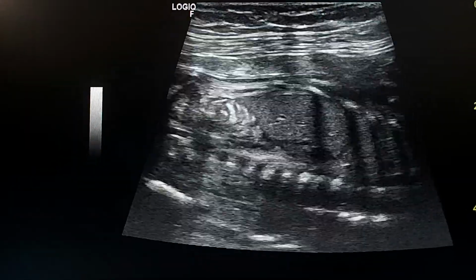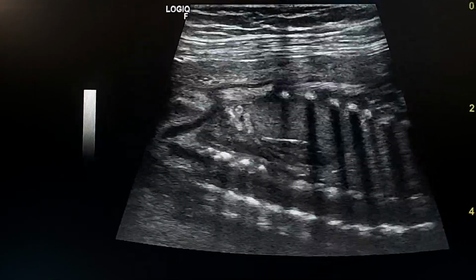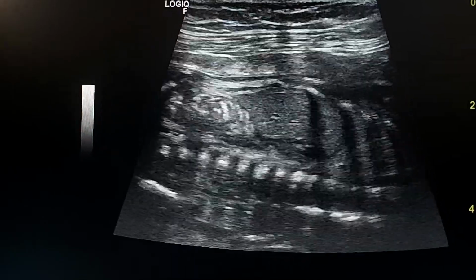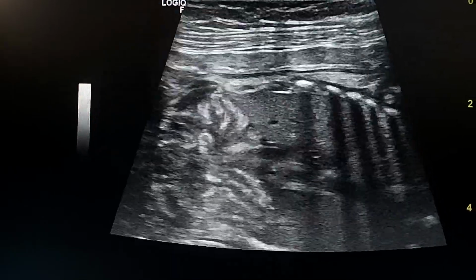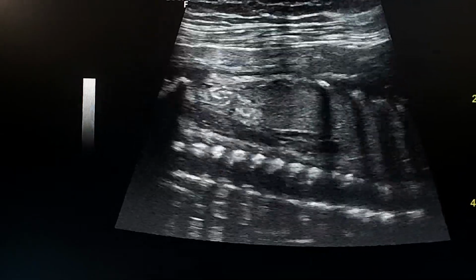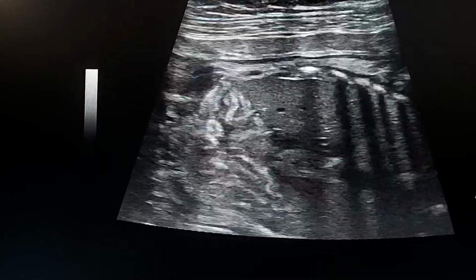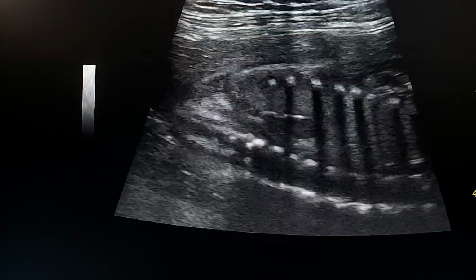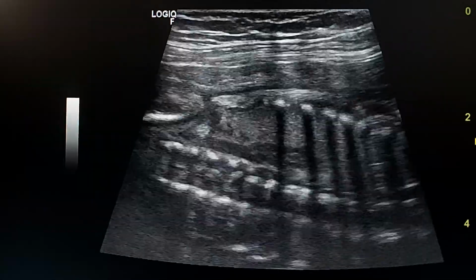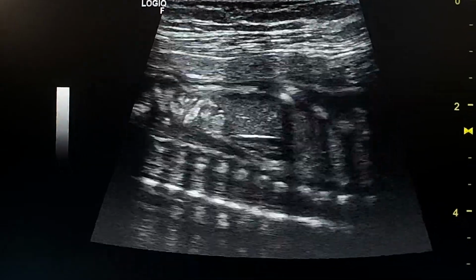Because of the linear shape of the adrenal gland in this situation, instead of the Y shape, which is the normal shape of adrenals, it is also described as discoid or elongated or pancake adrenal gland. Also, it could be called the straight adrenal gland.